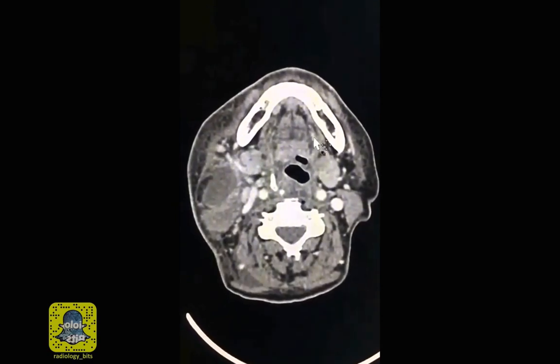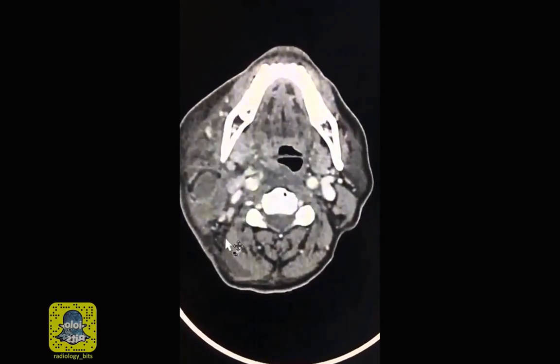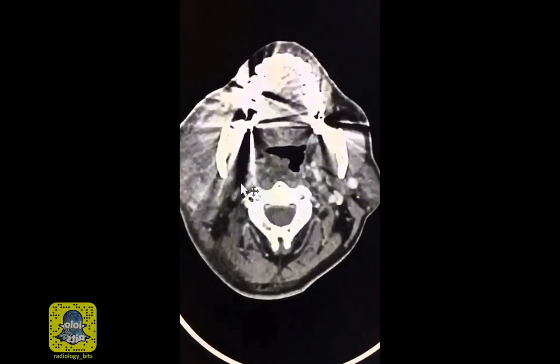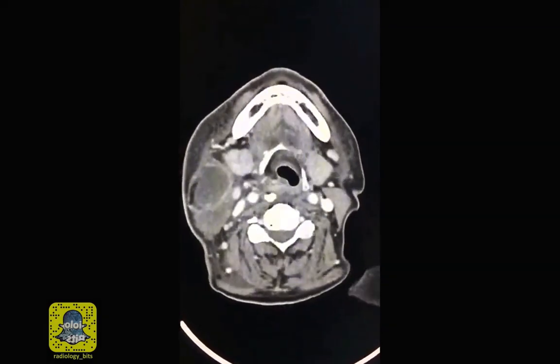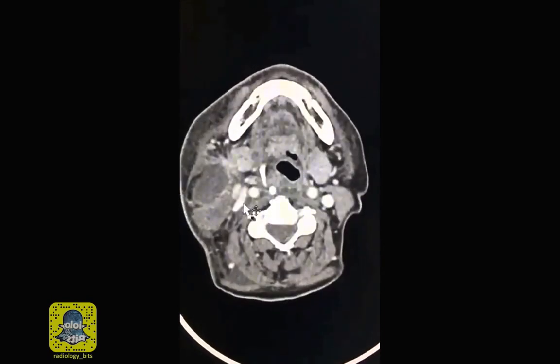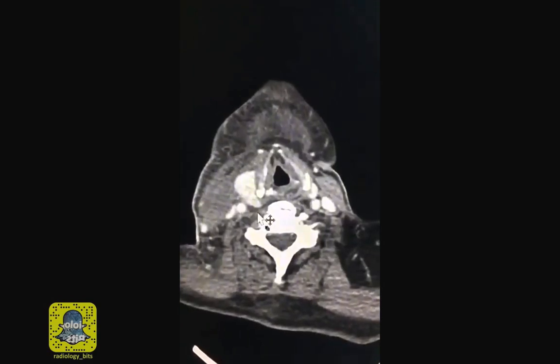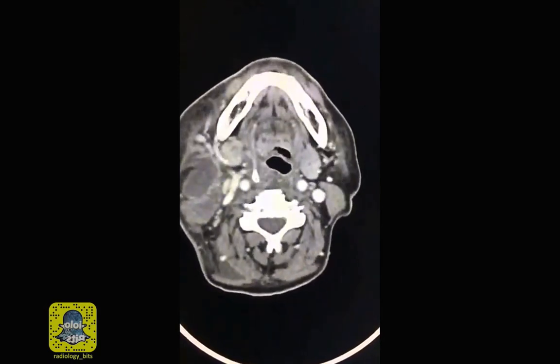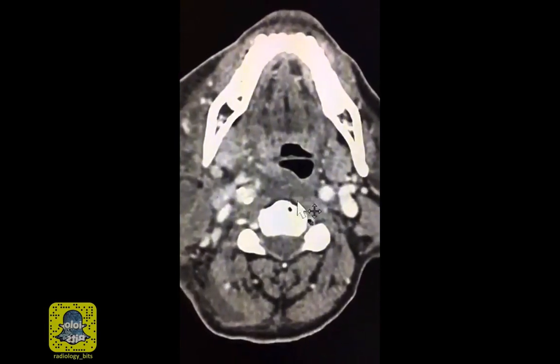Now for a few things that you have to mention in your report. Talk about lymphadenopathy, and we saw here a few mildly enlarged and reactive lymph nodes. Then talk about the status of the vessels and airways, so make sure they're not compromised. For example, the carotid could have a mycotic aneurysm, or the internal jugular vein may have thrombosis. Make sure the airway, in this case in particular, is not really compromised, and although it's narrowed at several levels, it's not obliterated.